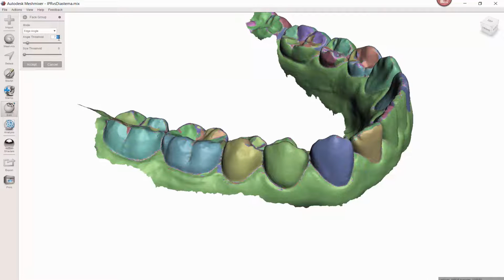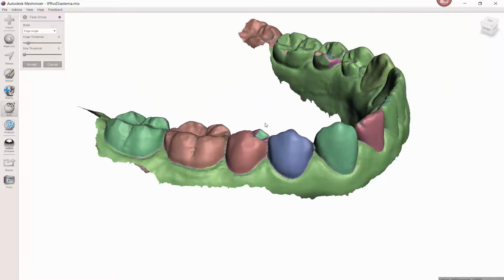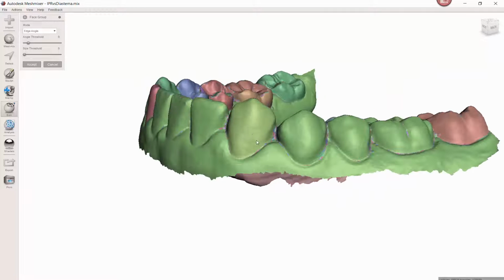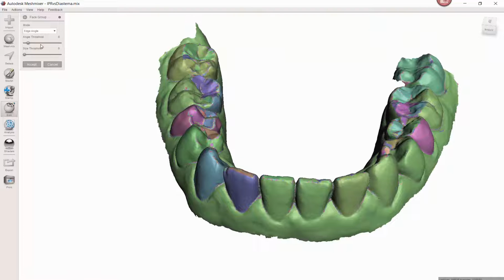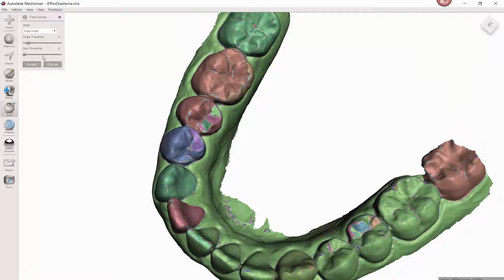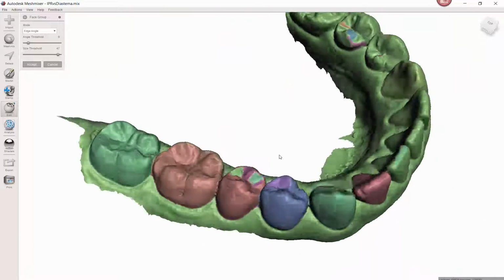I will tell you that in my testing, 9 seems to be a pretty good number. It doesn't get every single tooth. Okay, but if you look here, this one, this one, this one, this one, this one, this one, these incisors didn't. The canine did. It's a slightly different color, and the molar. Okay, so I could try 8. I think that'll be a bad choice. I think these incisors down here are going to struggle a little bit, and that's okay. But so I'm going to come back up to 9, and I'm also going to change the size threshold, because that's basically allowing us to have all these small areas. Okay, so if I start changing these, getting this super high, it's saying that no, it has to be a very big surface before it's allowed to be a specific tooth.